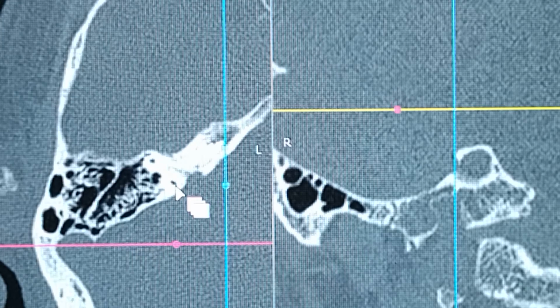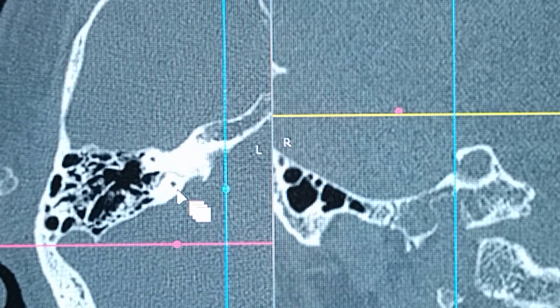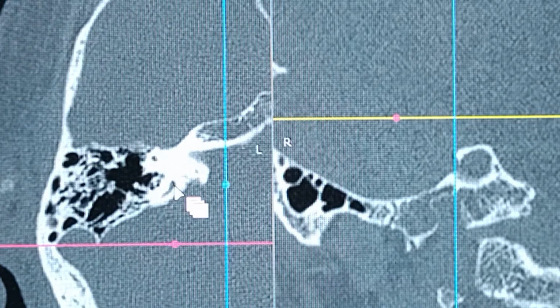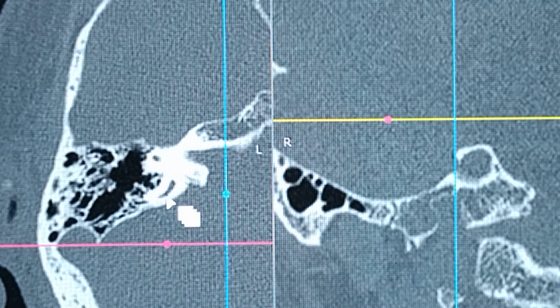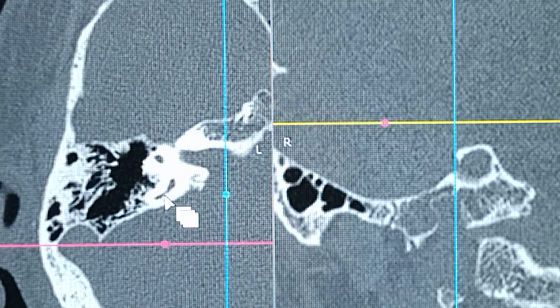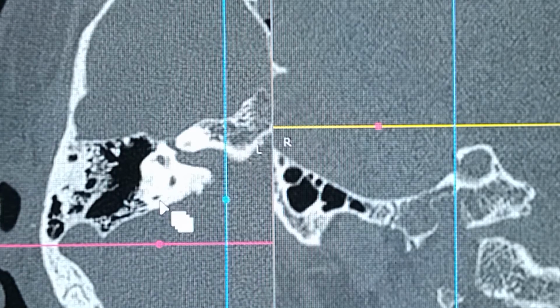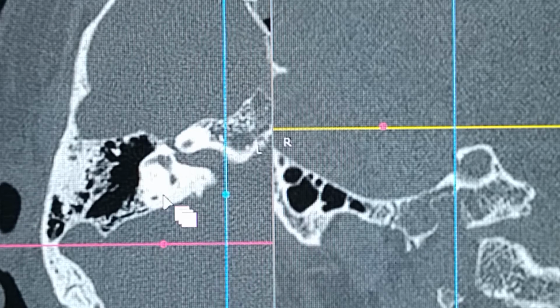As we keep on going below, you can see the subarcuate artery and the vein in the petromastoid canal, which runs below the dome of the superior semicircular canal. And then as we go below, you can see an extension here. This is nothing but the posterior semicircular canal. Why? What is this exactly? Now this posterior semicircular canal also has an ampulated and a non-ampulated end.